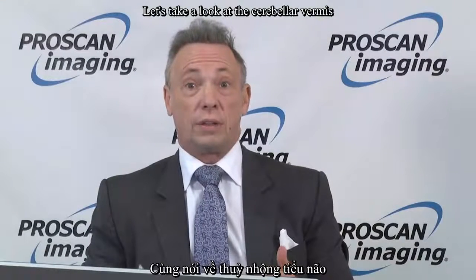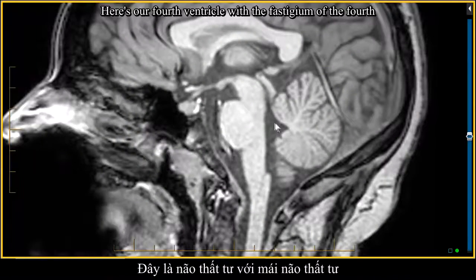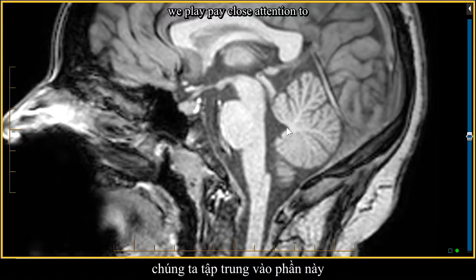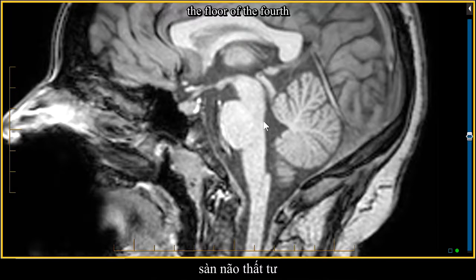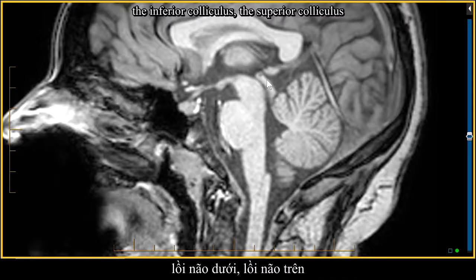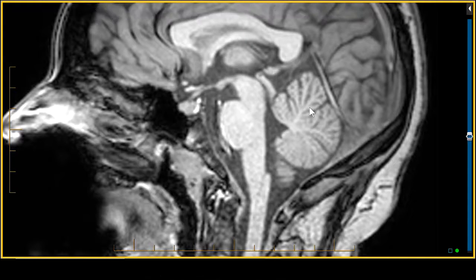Let's take a look at the cerebellar vermis on the sagittal midline with some magnification. Just to get us oriented, here's our fourth ventricle with the fastigium of the fourth, whose shape and pointedness and size we pay close attention to. Here's the inferior recess of the fourth, the floor of the fourth, where you'll find the facial colliculus bump, the inferior colliculus, the superior colliculus, the posterior commissure, the habenula, and the pineal gland.